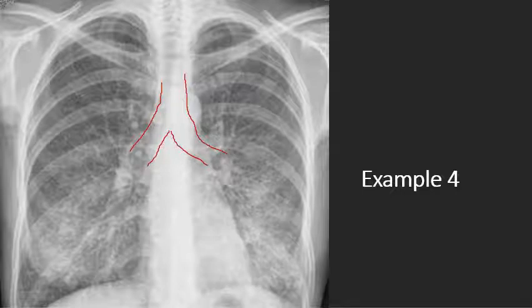Going down our B, we see these lung markings outside. Not a very good X-ray, hyperexposed, and we don't see the phrenic angles as well. We don't see their termination points, so you're going to get it top and below. And you see this as these global diffuse changes. So with these patients, looking at the heart, it's less than 2/3. It's not rotated. There's the aortic knob. The aorta's right here, doesn't look overly enlarged. And then our diaphragm, and under the diaphragm, there's our gastric bubble. This patient is not well.